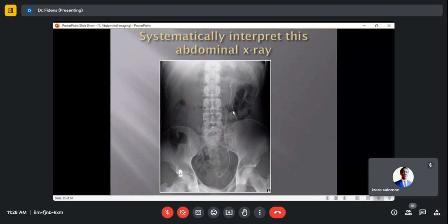Our intention for an abdominal X-ray, normally, even for chest, when you do a chest radiograph, in most cases it's not about the heart. It's about lungs normally. That's the indication. For abdominal X-ray, the intention is not about bones. The intention is about bowel loops, the abdominal cavity. So we don't have to have all the pelvic bones in.